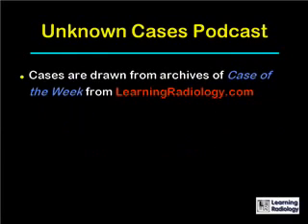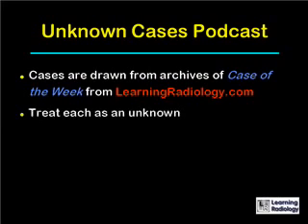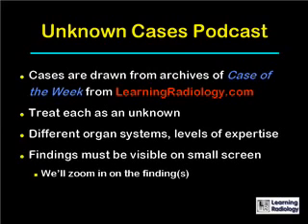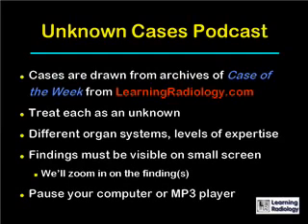These cases are drawn from the archives of the Case of the Week from LearningRadiology.com on the web. Treat each of them as an unknown. They're going to be in all different organ systems and at different levels of expertise. Since the findings have to be visible on a very small screen, we'll zoom in on the findings and make use of the pause control on your computer or MP3 player as you ponder the cases.